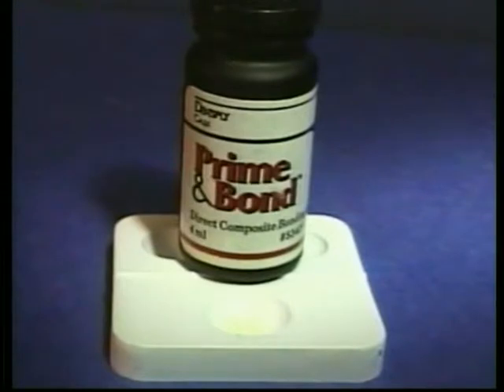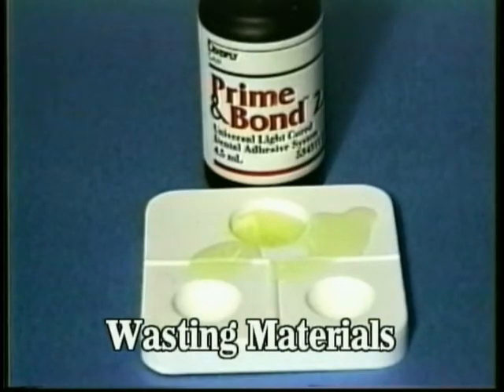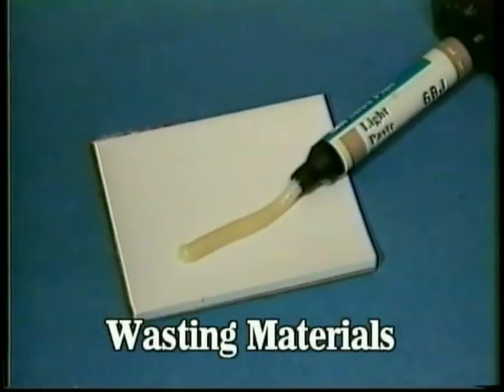The normal amount used for a conservative restoration is 1 drop. We measured out a bottle and found 60 drops in a 4 milliliter bottle. So each drop is worth $1. It's clear that you don't want to waste this material. Learn the typical amount to dispense, and if you're in doubt, ask the doctor rather than over-dispensing and wasting material.